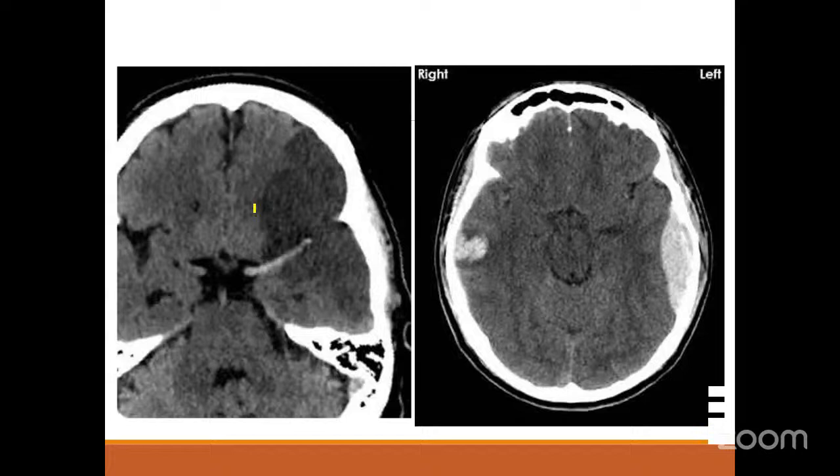So CTs, as we discussed, here you can see a hypodense area in the left brain, and some other bright structure we are seeing, which is like a thread. So we have a hypodensity, which usually indicates stroke, and you have a hyperdense thread-like structure that indicates there is likely a thrombus in this blood vessel. That indicates this is an acute stroke.